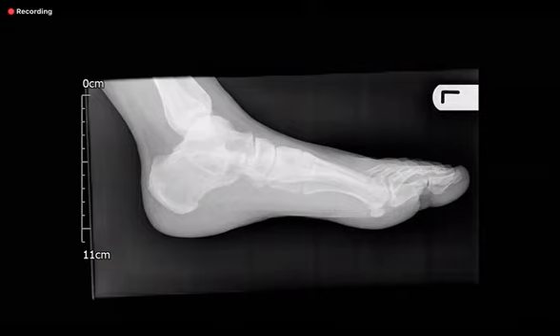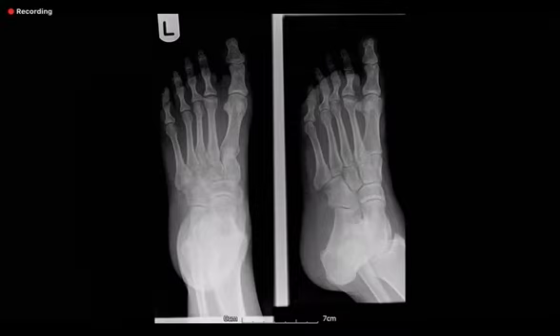And the examiner is asking you, plain film. Still you are in plain film. Here you have to remember, I have not shown you, but for talocalcaneal coalition, the axial view of the calcaneum is the best view. Why is that the best view? Because it shows you the subtalar joint. The subtalar joint has three facets: one is the anterior facet, second is the middle facet, and then the posterior facet.